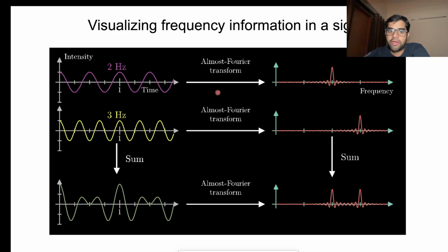Okay, so if you have a 0 hertz DC shift, this signal is centered at zero, right? If I add, let's say, three volts to this signal, it goes up. So 3 volts DC, a constant signal, is nothing but a 0 hertz signal. If there is a DC shift here, if I add some constant value to each of these, you will also see a peak at zero. Let's say this is zero, you will see a peak at zero and also a peak at one, at 2 hertz, or whatever frequency you're looking at. So if I add a constant value to this signal, you will also see a peak at 0 hertz. But right now the DC is zero.